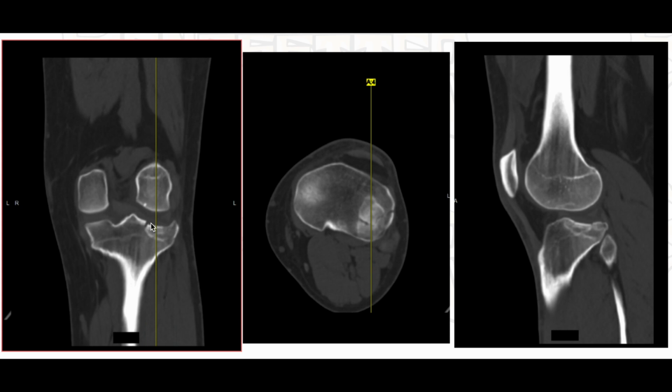The second thing you really notice is the fact that there's this fracture happening of the lateral tibial plateau, which you can see even better from this transverse view over here, how it goes pretty far into the tibia. And you can really see both decently well on this sagittal view of the person's femur and tibia, where you can see the fact that there's depression of this tibia along with fracture lines going in.